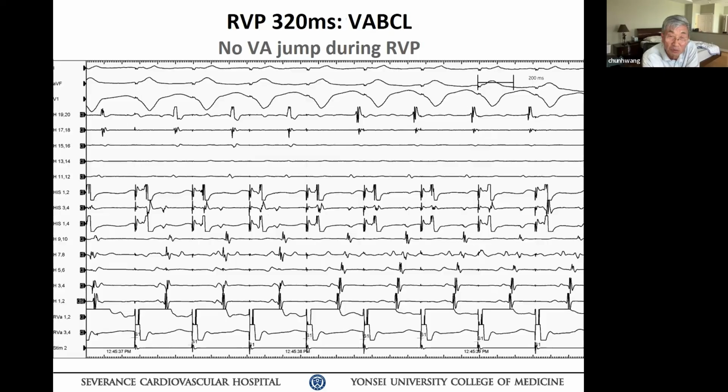I think that is also important for you guys to understand. If you look here, your V pacing shows a gradual fusion between septal and the pathway, right? But if you look at the first 2 beats of pacing, that's a fusion because your CS, proximal, distal all line up.